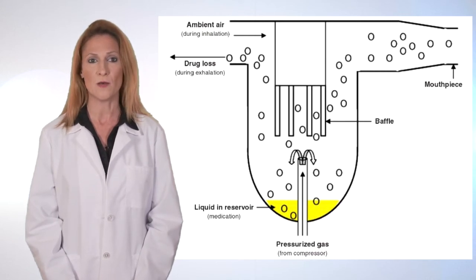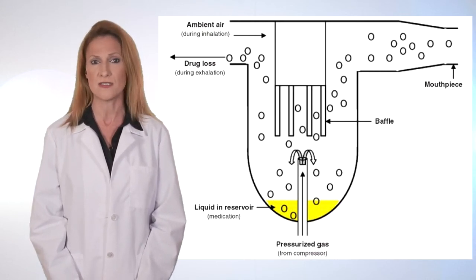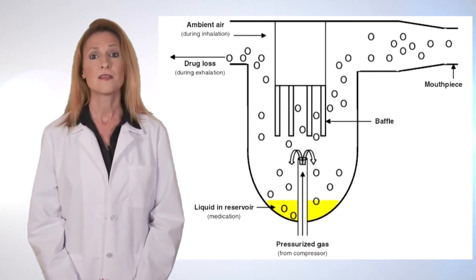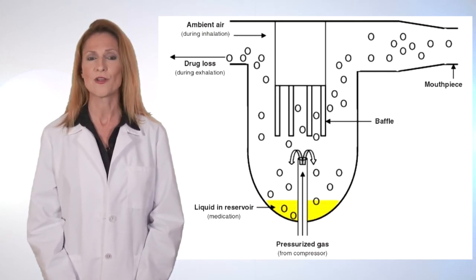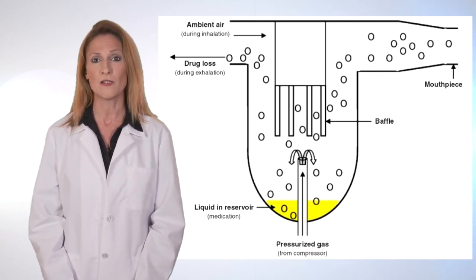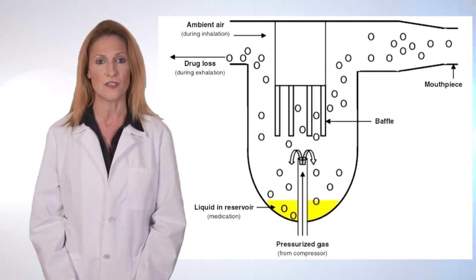The T-tube helps to decrease drug loss and increase the amount of drug inhaled. By acting as a reservoir, the T-tube holds the aerosol during the pre-inspiratory pause, allowing that medicine to be available at the beginning of the next inhalation.